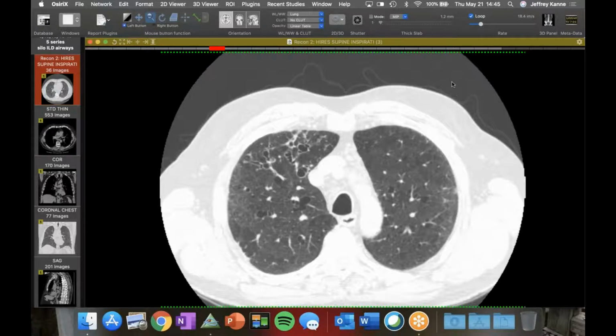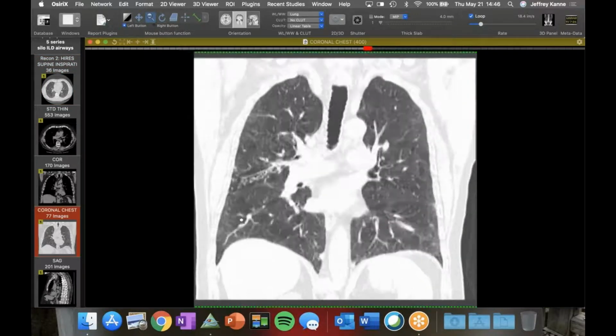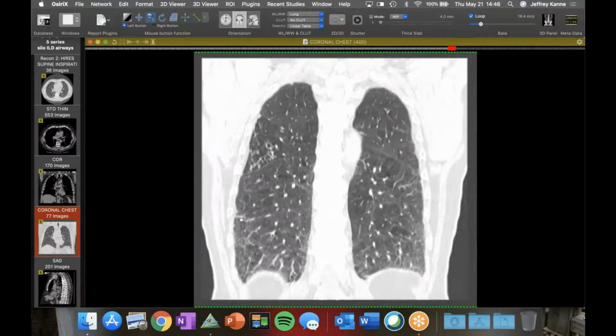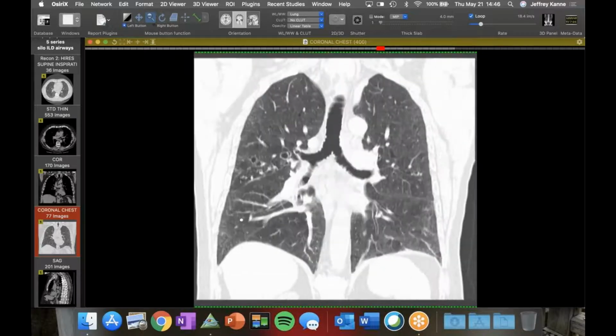Oh, curious case. Yep. I'll just put up the coronal real quickly so you can see the extent of the bronchiectasis. It's pretty impressive. So, Jeff, my understanding of silo fillers lung is it's not an immune mediated thing, but it is actually a chemical burn in the lungs because there are nitrogen oxides that, when they react with water, turn into nitrous acid or nitric acid, both of which burn the lungs. So it's really a chemical burn.